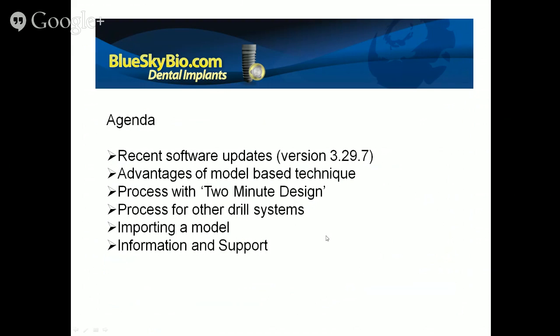The agenda for the presentation: I'm going to mention very briefly recent software updates that we released in Blue Sky Plan, the advantages of the model-based technique, which is what we're going to be focusing on in today's presentation, and the process flow, which I call a 2-minute design, but in actuality, you'll see it's a couple of clicks. Everything has been configured and updated and modified with new intelligence built into the software to make the process as easy and quick and simple as possible. So we're going to see that.